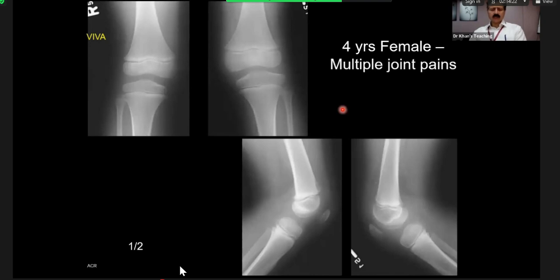Now, if you see here, JIA is extremely important. And again, the eye sees what the mind knows. One of the findings in JIA can be that because of hyperemia, there is accelerated growth of the affected epiphysis. And then there can be premature closure of epiphysis also. The same case, they might show it to you at the age of 20, 21, when the epiphysis has closed. And that I will show you shortly. So that also becomes a very important exam film.